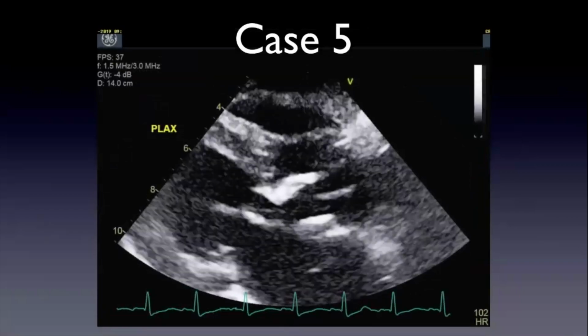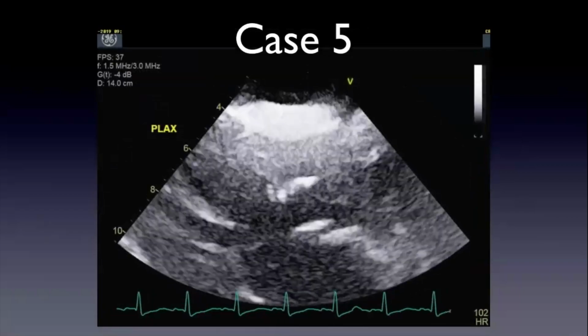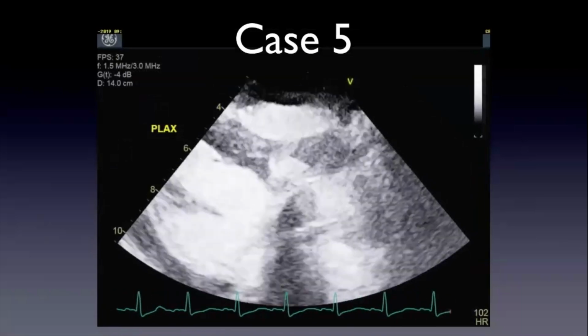So here's the first pass, and I'll play it a few times. So remember, you injected intravenously. It goes in the RV, LV.